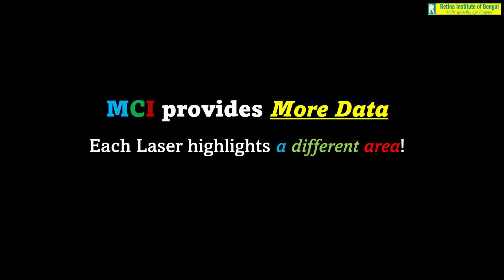But here you have basically three different maps of the retina from three different planes, which are being combined to create a composite image. And therefore, if you look carefully at not only the multicolored image, but the corresponding blue, green and infrared reflectance maps or images, you can make out much more about the pathology and the level at which that pathology lies and the effect it is having on the retina than a color fundus photo can ever tell you. So let us see a few examples to understand this better.